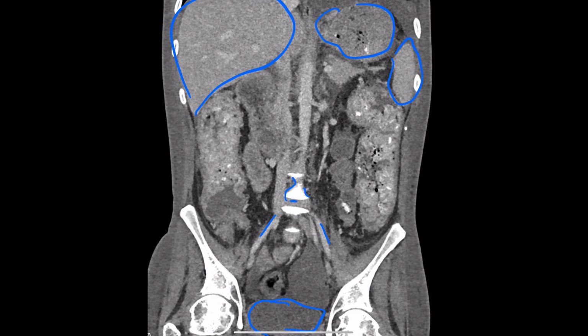So that's not the pathology. The pathology, though, is here. It is here in the colon. Okay. And here in the... Now, black is air, and I don't see much blackness in there, but the colon's filled. The colon is grossly abnormal here.